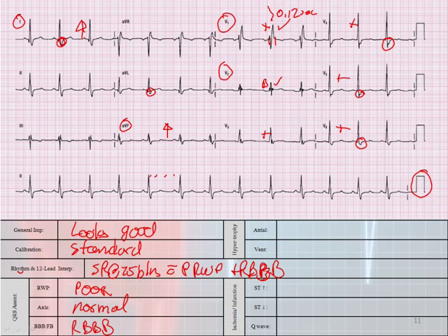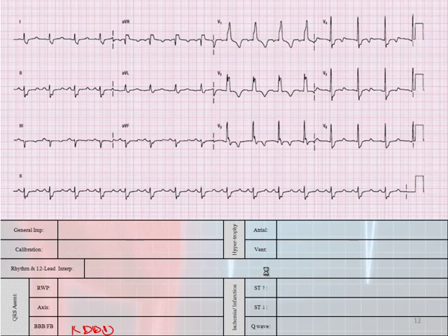Let's look at another one. General impression, first thing I see is that it looks wide.